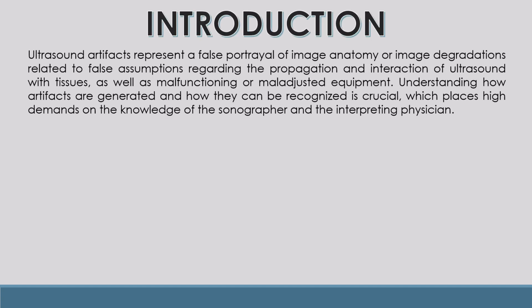Ultrasound artifacts represent a false portrayal of image anatomy or image degradations related to false assumptions regarding the propagation and interaction of ultrasound with tissues, as well as malfunctioning or maladjusted equipment. Understanding how artifacts are generated and how they can be recognized is crucial, which places high demands on the knowledge of the sonographer and the interpreting physician.